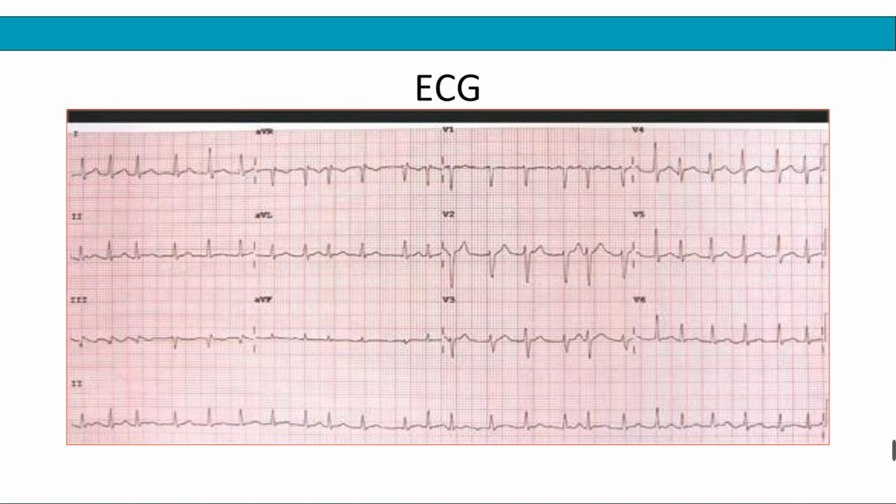T-wave, you look for in all the leads. QT interval duration is good on augmented AVL, which is the best lead to determine the QT interval. Then sometimes you see U waves in leads V2 to V4. That's generally the approach.